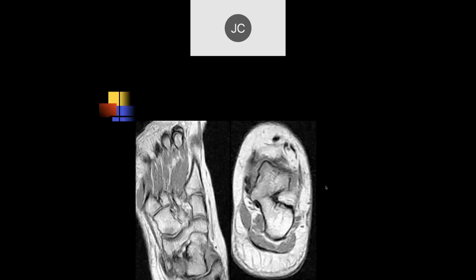Okay, Robert. All right. Let's see. Looks like there's another osseous coalition, and I think it's the navicular and cuboid again. Okay. And then let me show you some more images. So here are the axial images, and it's a little hard on one cut to figure out what's going on. That's the cuboid over there, and the part of the calcaneus back here.